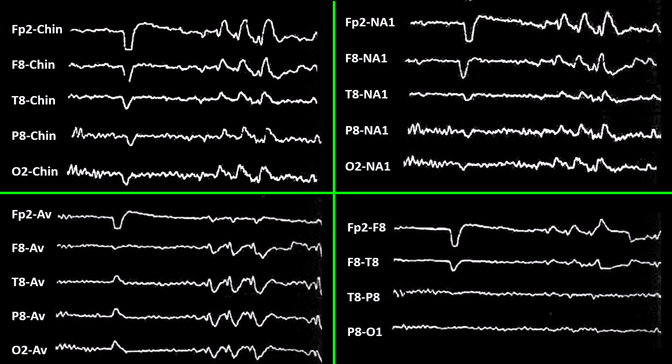Please take a few seconds to review it. Imagine how different the description of this event would be if you chose to describe it based on the montage using bipolar reference instead of if you were to use the chin as a common electrode reference montage.